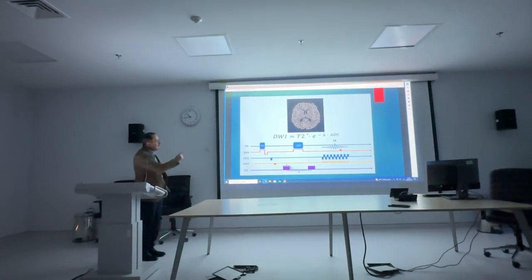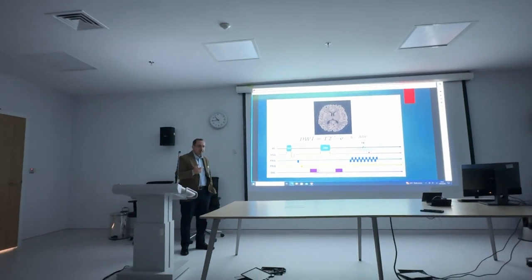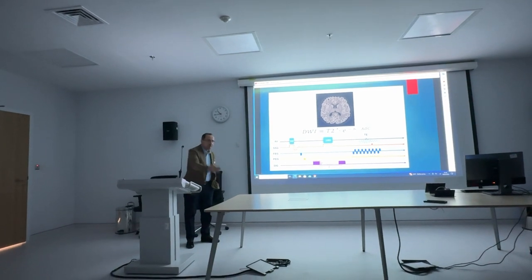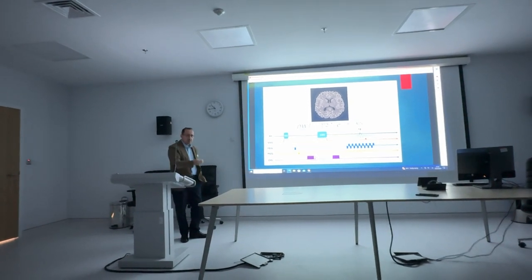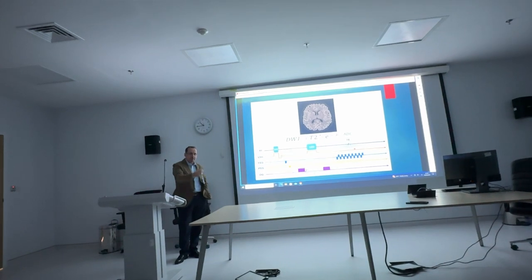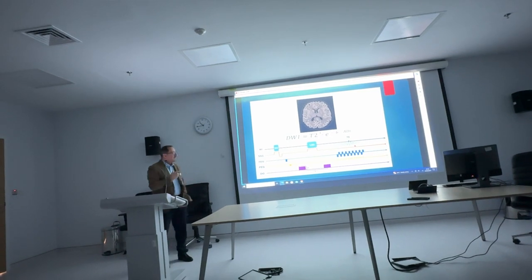Still, we are having this high signal in the surrounding of the brain convexity. Why? The answer is because we are basing our study on top of T2. T2 is the mother of the sequence, so there is always contamination of the sequence by the mother sequence, which is T2. But there is an element of brightness, although we achieve the strong dephasing. Let's go for our critical point.